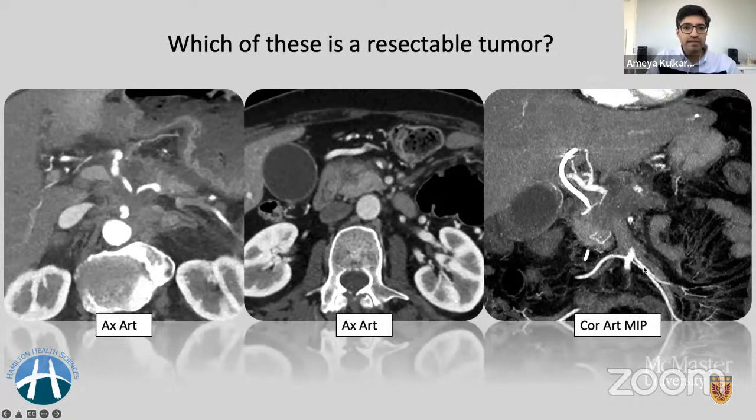Now, looking at these images, you definitely start to notice that some of these areas don't look nice, like those in keeping with pancreas carcinomas. This was our quiz image. So we will dissect it one by one.